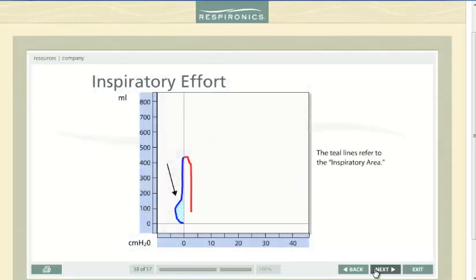This is a spontaneous breath. The black arrow indicates imposed patient work of breathing. Inspiratory effort to the left of the vertical axis translates into an increased inspiratory workload for the patient. When the graphic is frozen, the amount of imposed patient work is estimated by the Esprit ventilator and is displayed as inspiratory area. This is commonly reduced by instituting flow triggering or increasing pressure support.